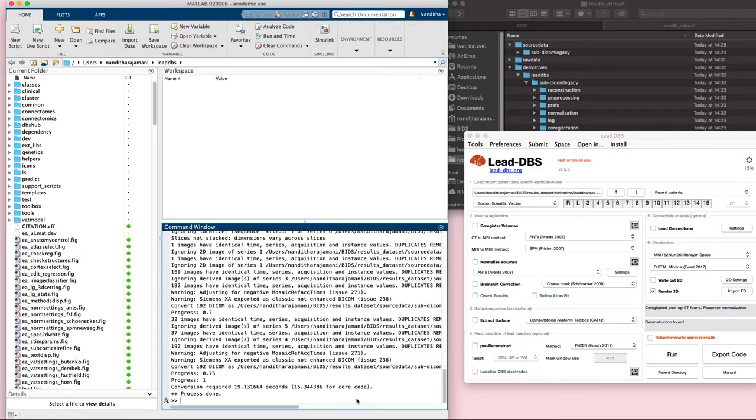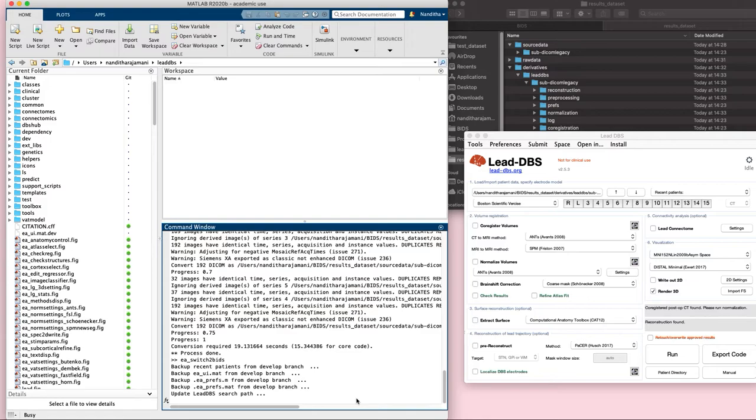This includes backing up your preference files and also changing your space folder from the MNI_ICBM to MNI 152. In order to do that, we've created a script which is called EA switch to BIDS, and when you run that script, you will back up all your recent patients, the EA prefs file, and also update your Lead-DBS search path.